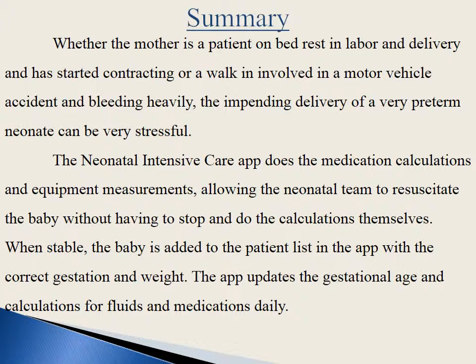When stable, the baby is added to the patient list in the app with the correct gestation and weight. The app updates the gestational age and calculations for fluids and medications daily.